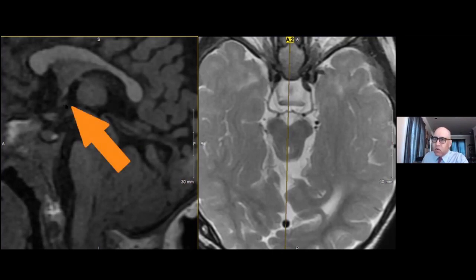Here we see what may be an interhypothalamic adhesion. This is a finding that has been seen slightly more commonly in the setting of a Chiari type 2 malformation. Notice other adjacent structures. There's the massa intermedia. There's the anterior commissure, the optic chiasm. But this structure right here, just posterior to the lamina terminalis, might be an interhypothalamic adhesion.